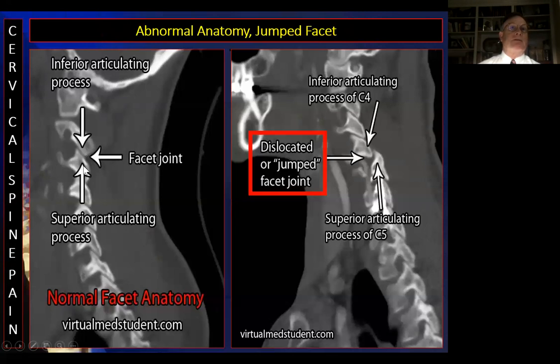Superior articular facet of C3, and there's the inferior articular facet of C2. Here's C1 and the odontoid. You do flexion and look at the subluxation. So now you've got a jumped facet, and this is unilateral in this patient, but it could be bilateral. It's very dangerous.